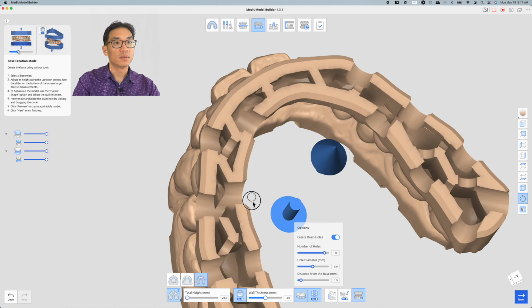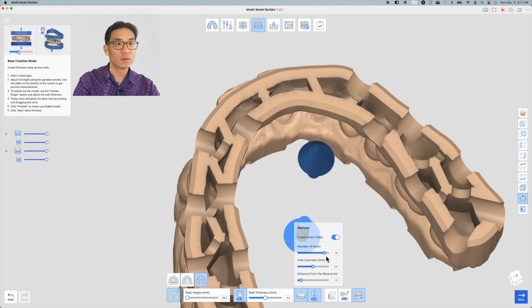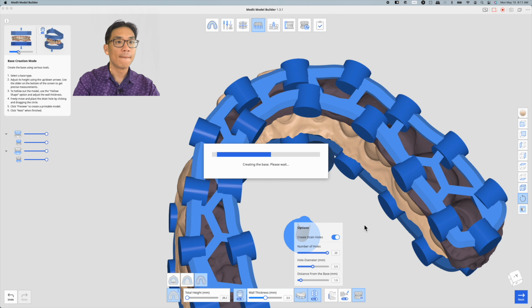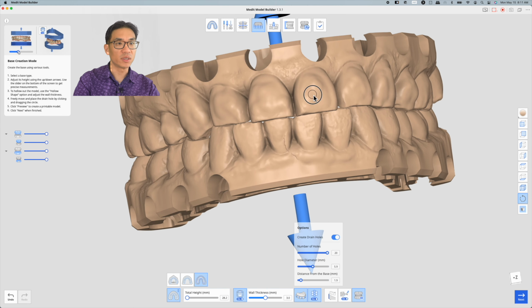And so, well, it didn't completely fix it, and I still have that issue there. Let's try one more time. This is a bit overkill with the number of drain holes, but you can see when this drain hole, well, I think it's trying to protect the data here.